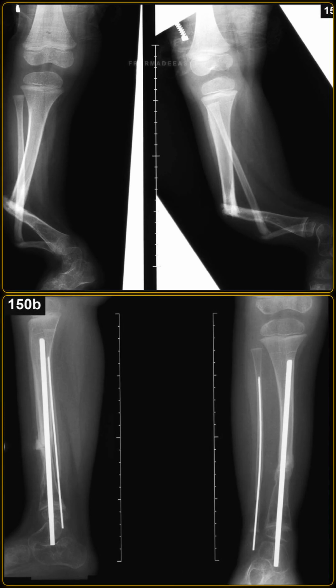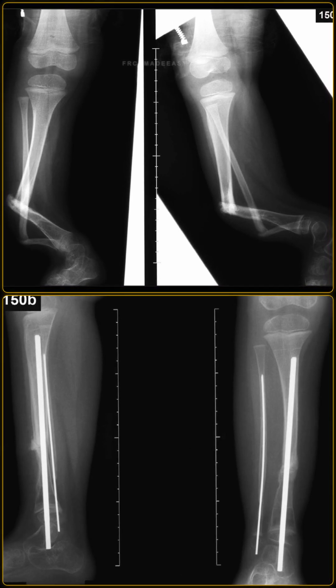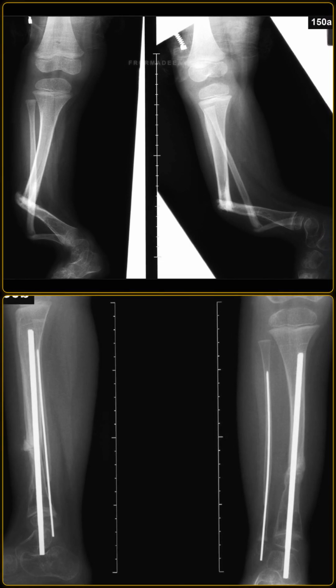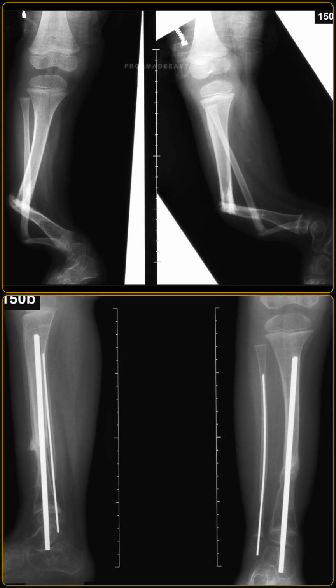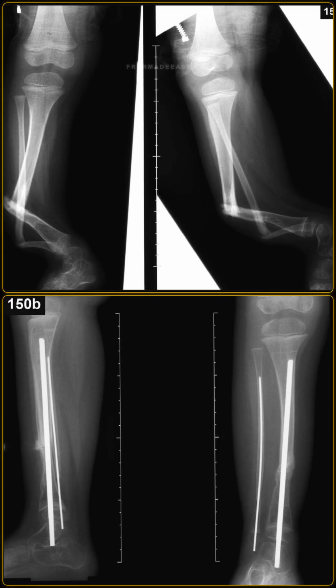As a radiologist, I would recommend comparing these radiographs with prior studies to evaluate the degree of bowing progression or post-surgical hardware stability. I would recommend obtaining a dedicated MRI of the lower leg to evaluate the extent of soft tissue neurofibromas and the viability of the surrounding musculature.